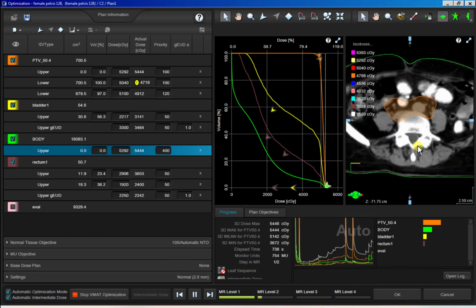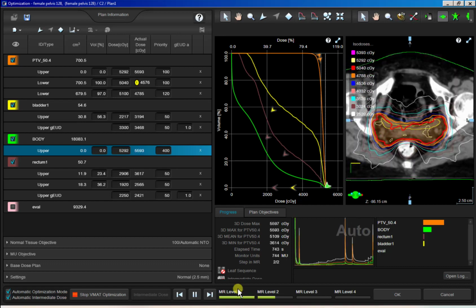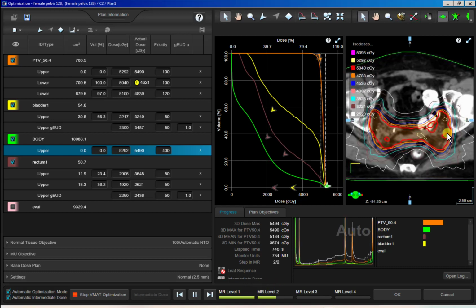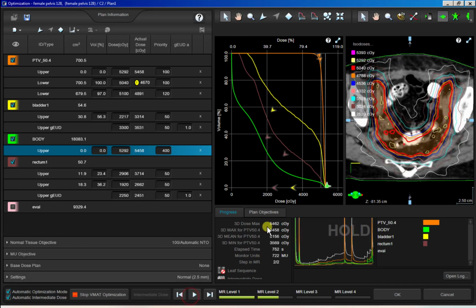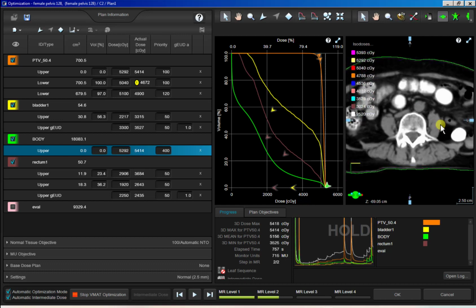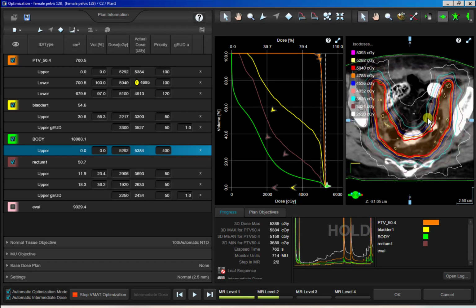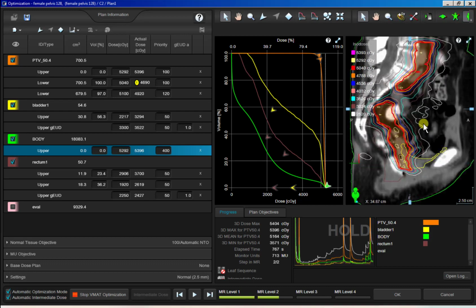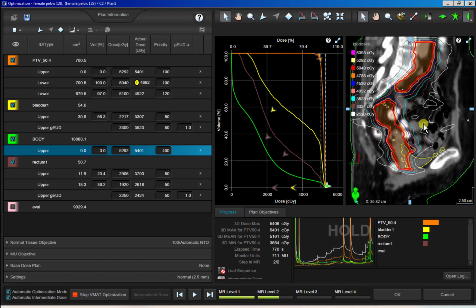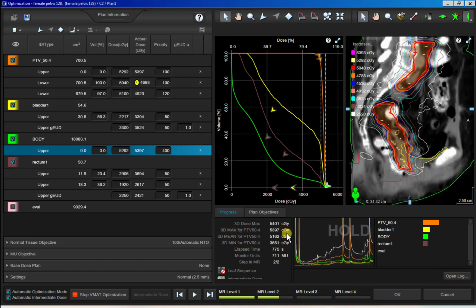Always a good idea to scroll through. Make sure everything's looking okay. In these early levels, your lines will be all jaggedy and kind of weird looking. That's okay. That's to be expected. I'm just kind of in general looking at all my lines and seeing if they're all bunched and kind of shaped out well. I always like to look at all of my planes. You can definitely notice different problems a little bit easier in different views. Everything's looking pretty good though, I think.